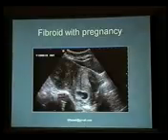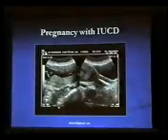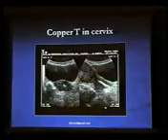Here is a case in which this is an anteverted cervix and a retroflexed fundus where you see a gestational sac here and embryo, and this was an anterior wall fibroid here. Adnexal mass, and this is a dermoid. One can see an intrauterine contraceptive device in addition to a pregnancy which is going on normally.